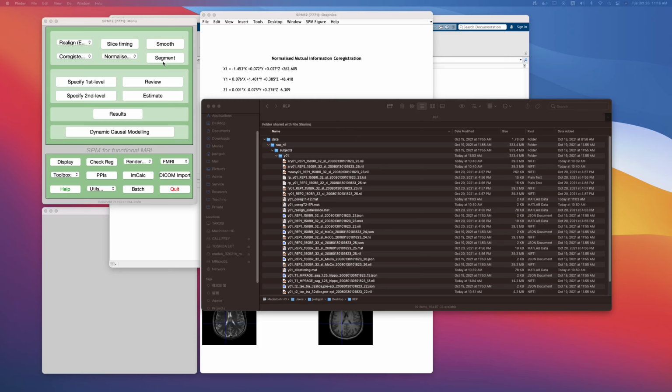It does this as a first step, and in addition, it will compute and derive some parameters that will be useful later on, that we will be using to do the spatial normalization that I talked about, the deformation, where we will want to bring this subject's brain to a common brain space. In our case, the Montreal Neurological Institute, the MNI brain space.